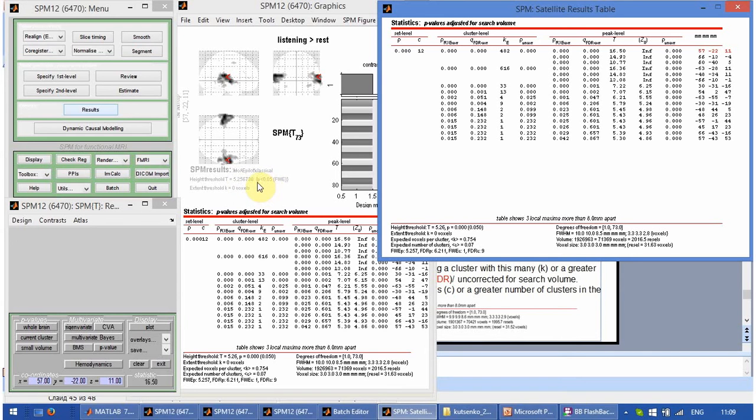For this level of statistical significance, this is surprisingly high. Typically, Student test statistics give significant results at 2.3 or something like this. Why is it so high here? Because of those letters which are shown in the brackets.